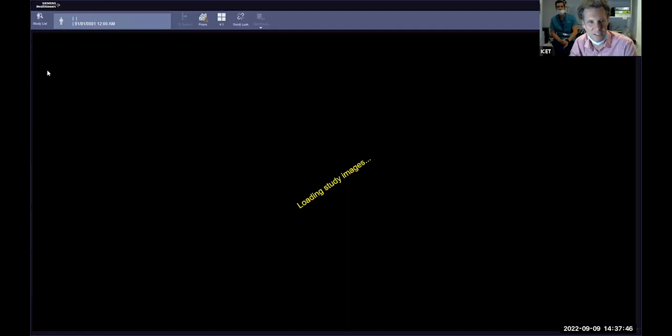Guess no, and I always find these deep transgastrics pretty challenging sometimes to try and pick up things like that. I can often get gradients, but I'm just having a look for you, just sorry, because I'm going to anonymize his name. We don't have any deep transgastrics, I'm afraid. As I say, I'm sorry, I didn't do this. I just saw my friend reporting on this case and asked if I could steal it for the teaching today. No, I'm sorry, we don't.